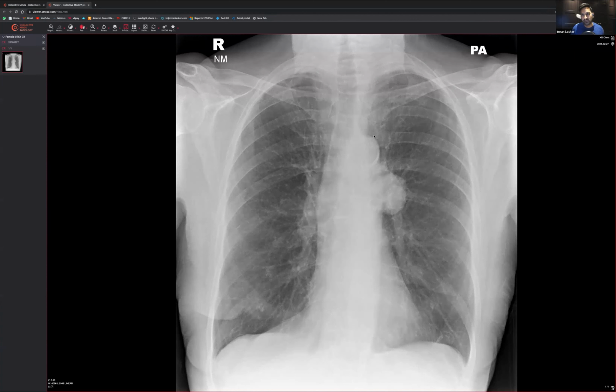Someone said adenopathy. So we've got an aortic knuckle sitting over here, and then you can see that aortic arch going down there. Look at the hilar. It maybe looks a little bit, well, I don't know. I think that actually looks okay. But yeah, I agree, there's something a bit abnormal about that area there. It can be a unilateral adenopathy. Of course it can be. There's no doubt about it.